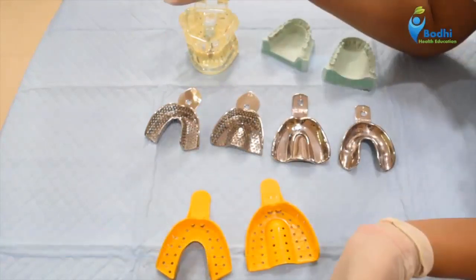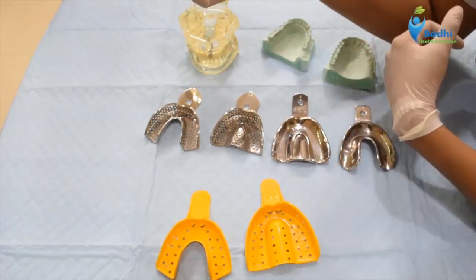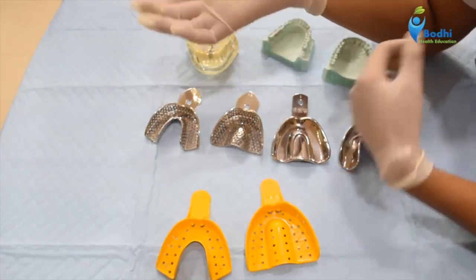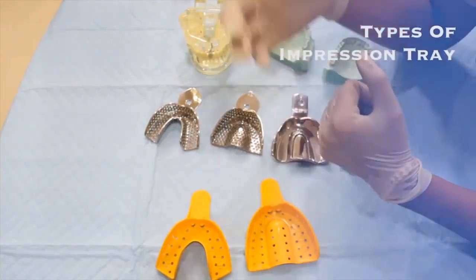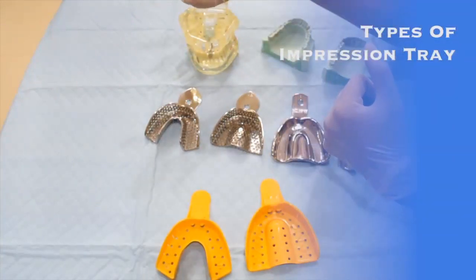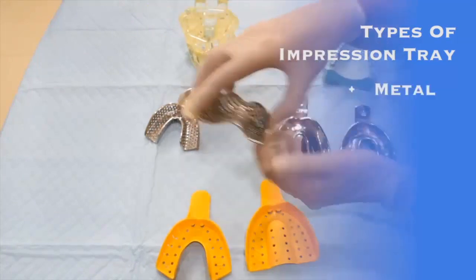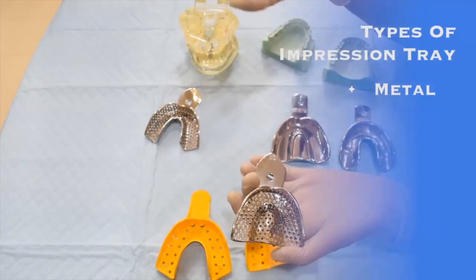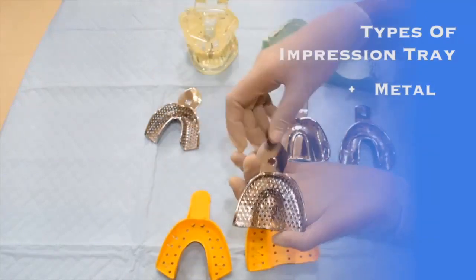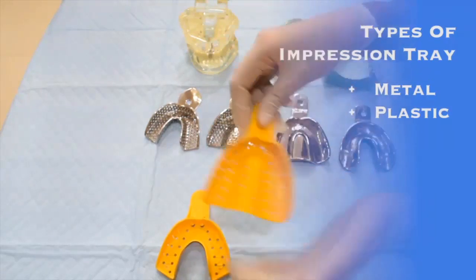So now that you know about the parts of an impression tray, and what is a maxillary impression tray and what is a mandibular impression tray, let me classify the impression trays. There can be various classifications. One is according to the material. So impression trays can be either metallic, and the metallic impression trays can be made out of stainless steel or aluminium, or plastic impression trays.